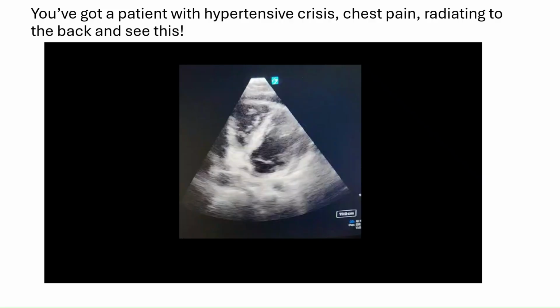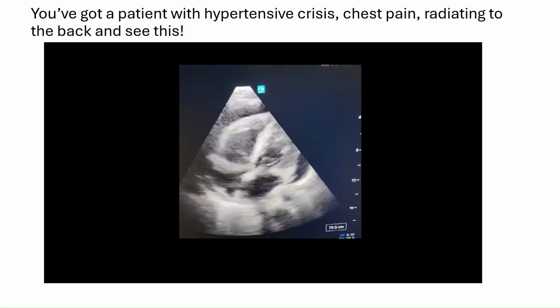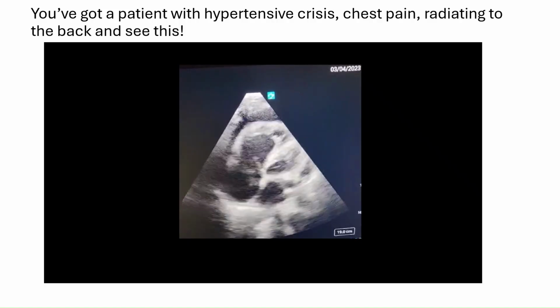And on the next slide, we can appreciate one important clinical scenario. Imagine you have a patient with hypertensive crisis, chest pain radiating to the back. You did your bedside ultrasound, and you see this is what's going on, right? So are you going to be concerned? Definitely, right? Because you have suspicion for aortic dissection, you're putting your probe on the patient's chest and you see some kind of pericardial effusion.